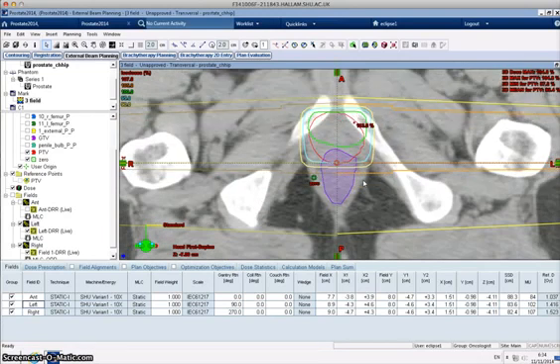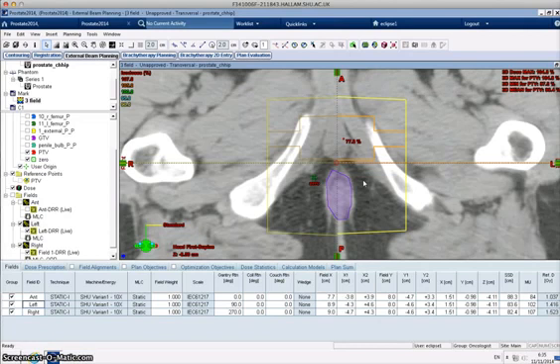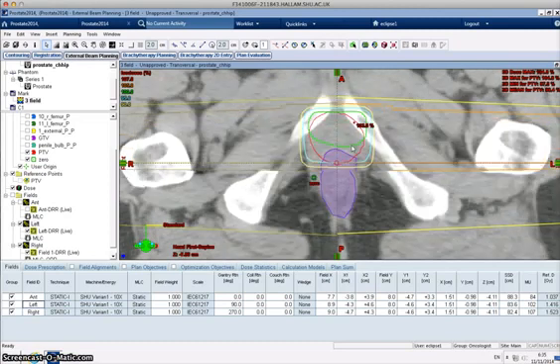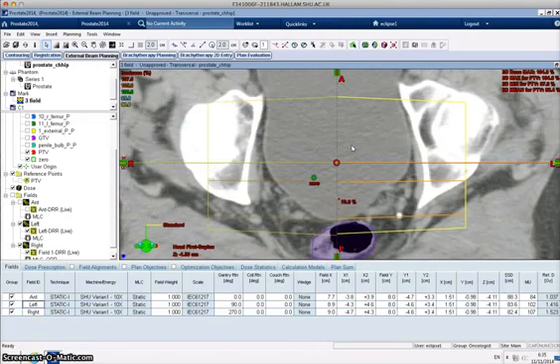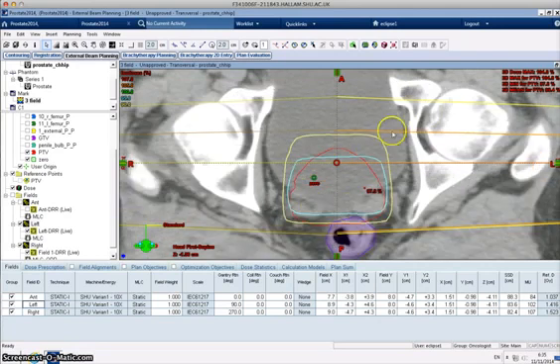One last thing to mention about field size. Typically, if we set the field size to 0.5 superior-inferior, as we have done, then we're typically going to underdose at either end superior-inferior. So we can see there that this is covered by the 90% isodose, but it's not covered by the 95. So we need to open up the field size there. And if we scroll to the other end, we can see that once again it's covering with the 90% isodose just about, but not with the 95.